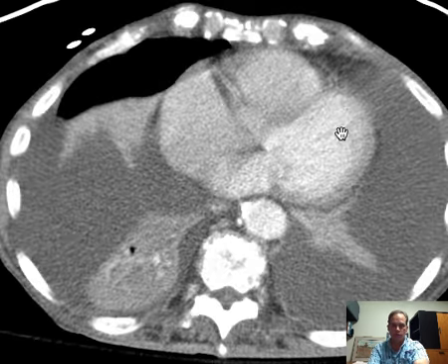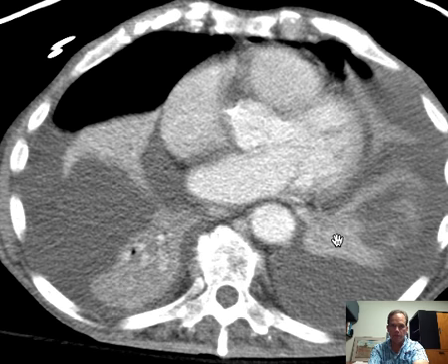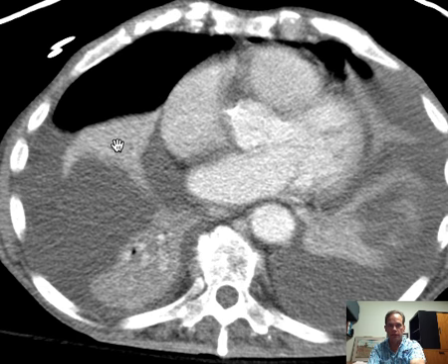Well, first of all, this is lung tissue here, this is lung here, and this is lung there as well. So these areas are not aerated. So you have areas of non-aerated lung on both sides. Just a simple little descriptor to summarize what we're seeing. Why is that? The fluid around the lung has accumulated to such an extent that it is compressing the lung, pushing the air out of it, and thereby creating what we call atelectasis, or volume loss.